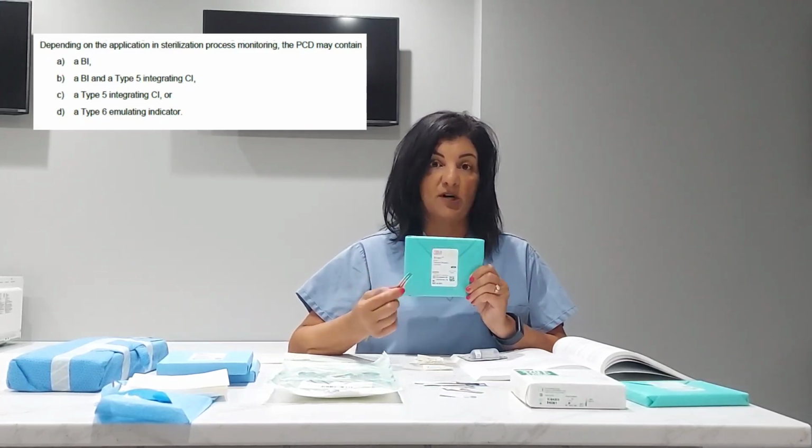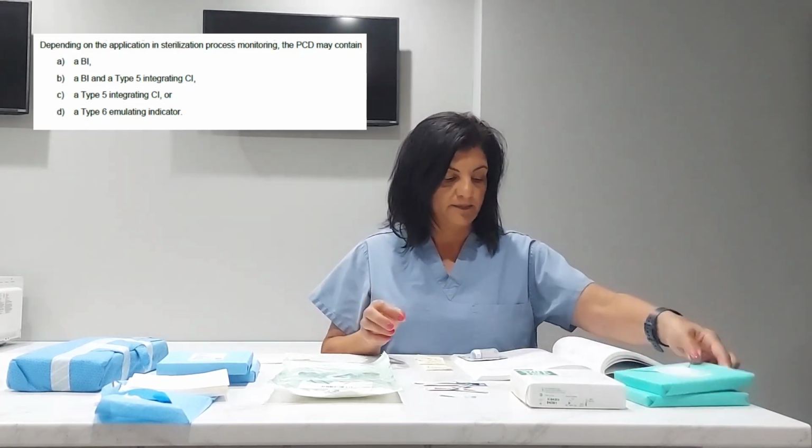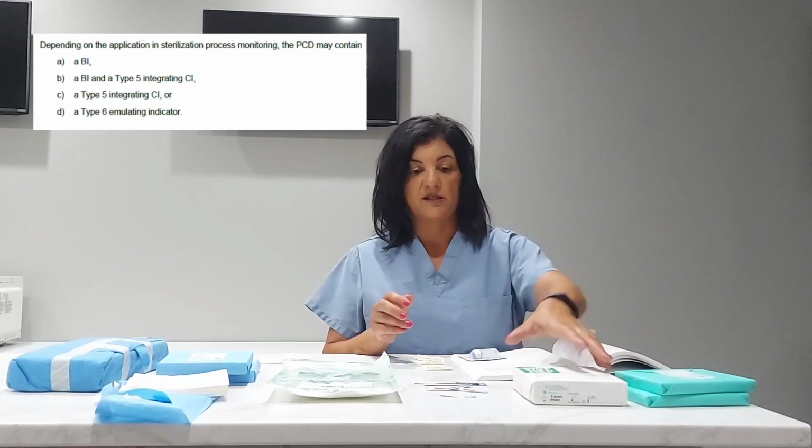Again, PCD, process challenge device, to ensure that sterilization is occurring. Or a class 6 would also be a process challenge device.